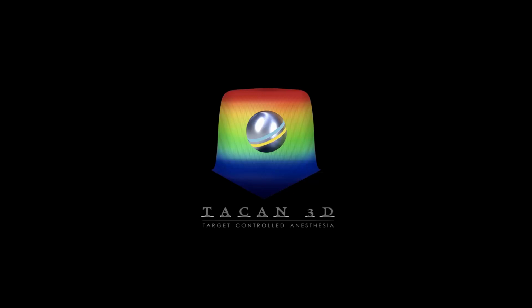Today we would like to present the first software that incorporates the software model in the administration of anesthesia with Remifentanil and Propofol. What is Tacan 3D? Tacan 3D is an innovative software that incorporates the synergic interaction between Remifentanil and Propofol in a very user-friendly interface.